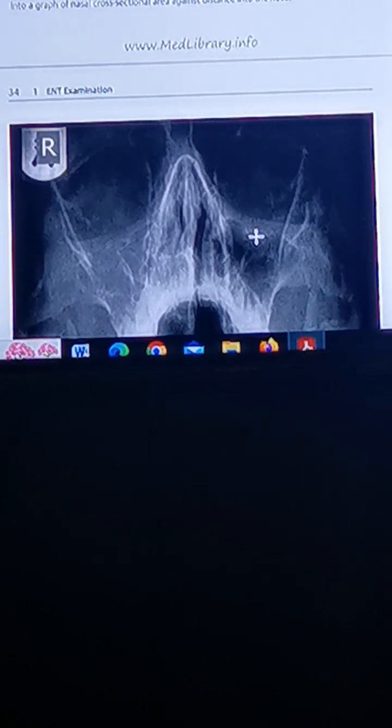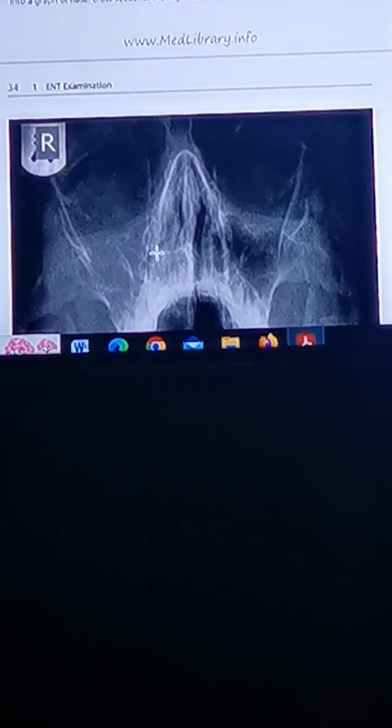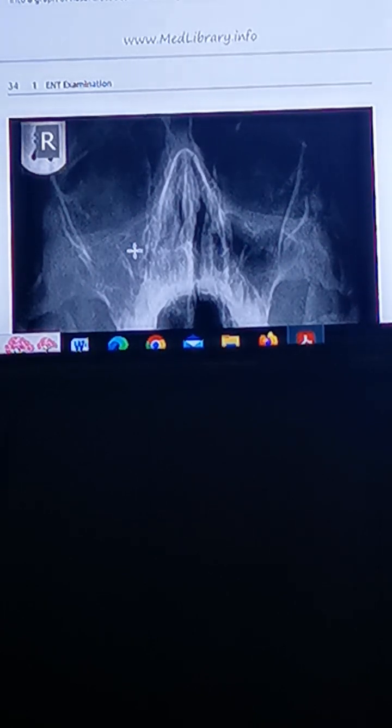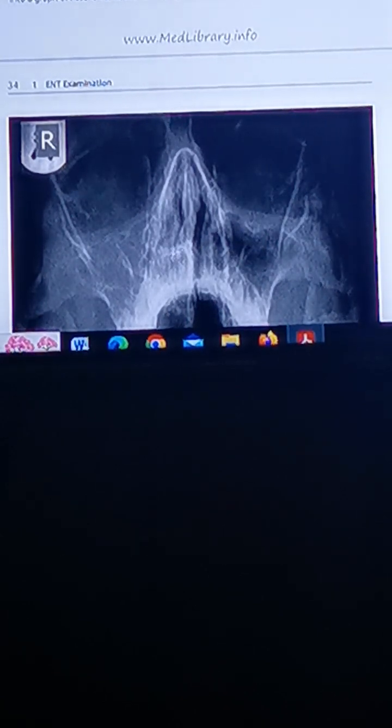nerve and infraorbital vessels. In case of tumor, sometimes it is involved by the malignancy and there is paresthesia of the cheek of the patient. So we look at whether it is destroyed or not in case of tumor.